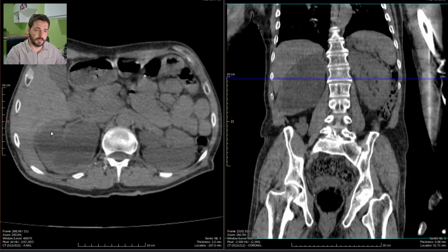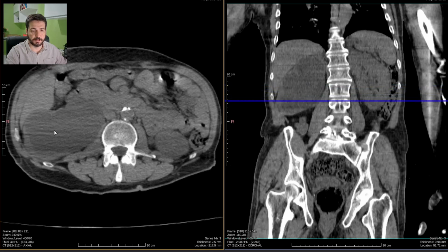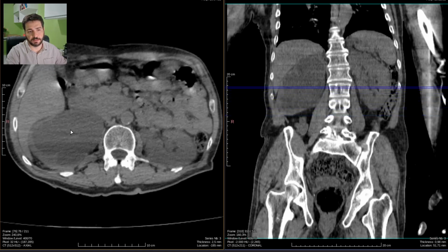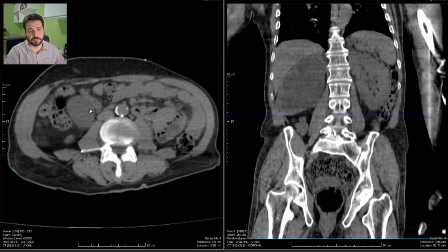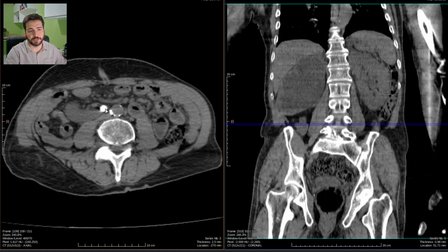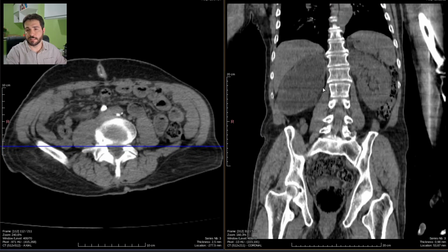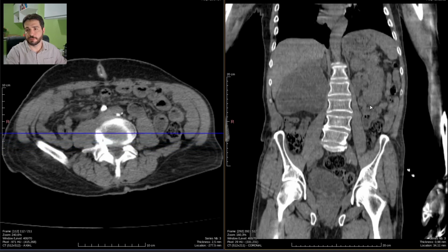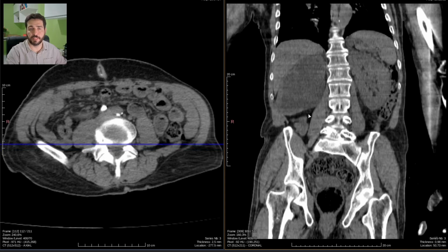There is thinning of the parenchyma and a diffuse massive dilatation of the calyces all over the place in the pelvis and the proximal ureter, until we reach this major calcification inside the ureter. This is a stone, but as you see right here, the pararenal fat isn't densified, it shows no signs of stranding, which tells me that this isn't a very acute disease.